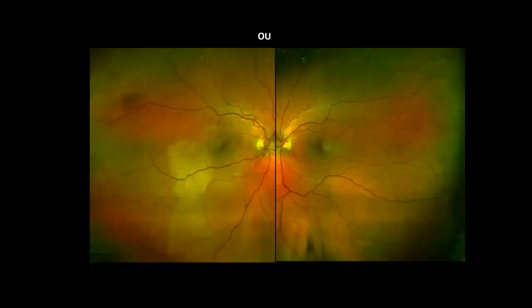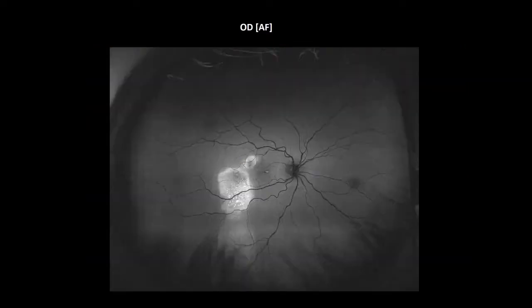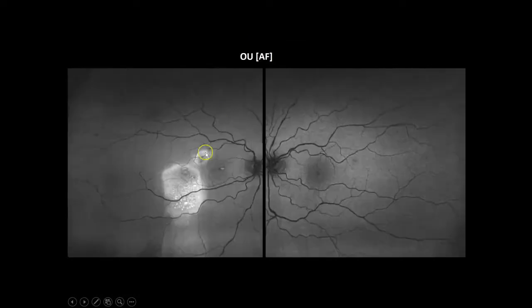Here's another case that you may recognize. Now let's look at it, right eye versus left eye. Let's look at the autofluorescent images. And there we are. This is actually an optometrist of interest, and he knows about this problem. He's aware of a blind spot, as we'll see in a second. Most of the lesion is infratemporal to the fovea. Hence, if he's going to be aware of a blind spot, it's probably going to be superior nasal. Here's his other eye, so it's mostly in his right eye. Very little going on in his left eye.